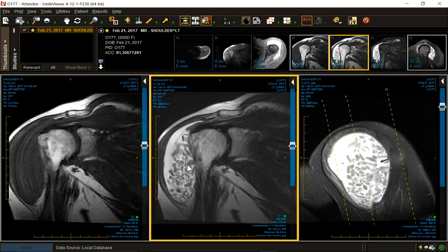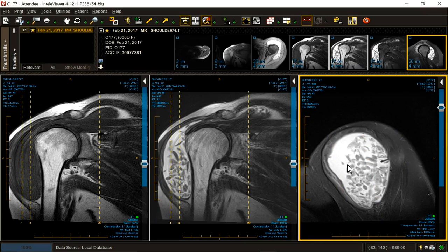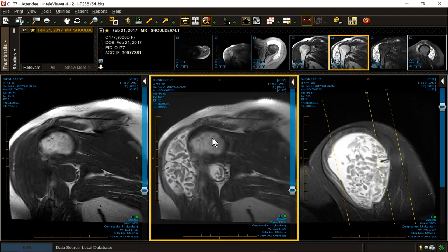What about CPPD? CPPD in itself wouldn't explain these objects that have grown in size. So there could be complicating CPPD. CPPD could be the inciting factor that led to a metaplastic response. So it could be secondary synovial chondromatosis due to CPPD. That's a possibility. What about amyloid?